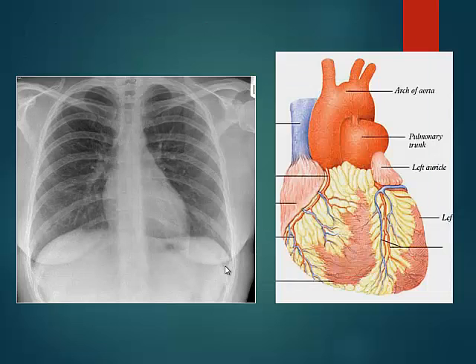So if you look at a chest radiograph and see what are the different structures in relation to the anatomy we see. On the right side, starting from cranially, what is this structure normally formed by, this area? You can see here, that's the SVC. In a normal patient with normal pressures in the right heart, the SVC is barely visible.